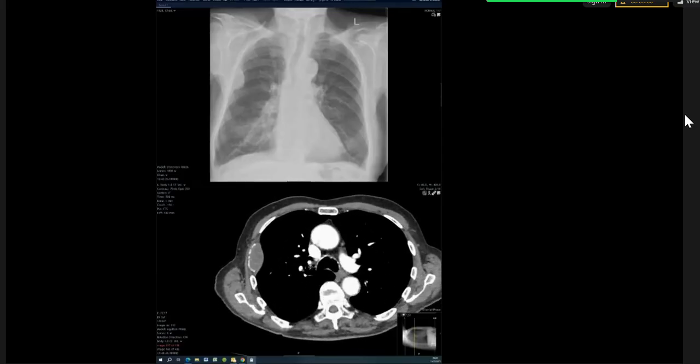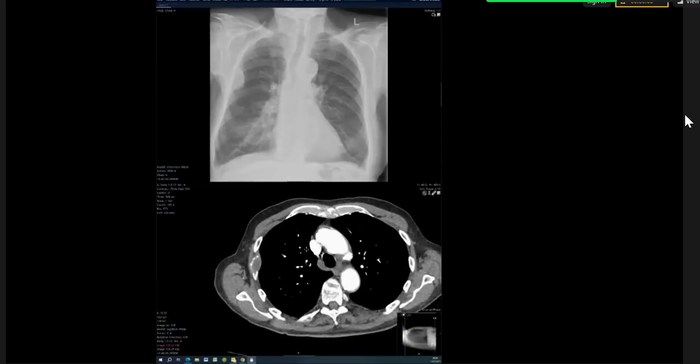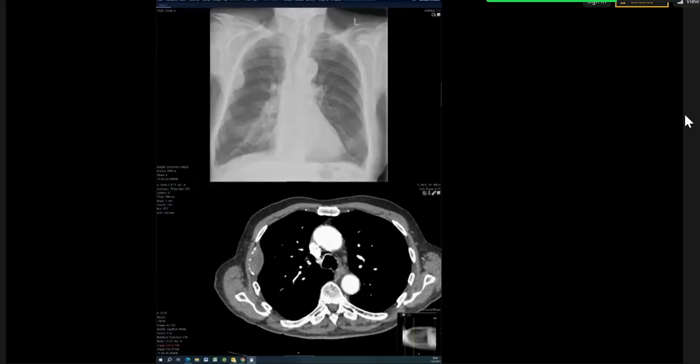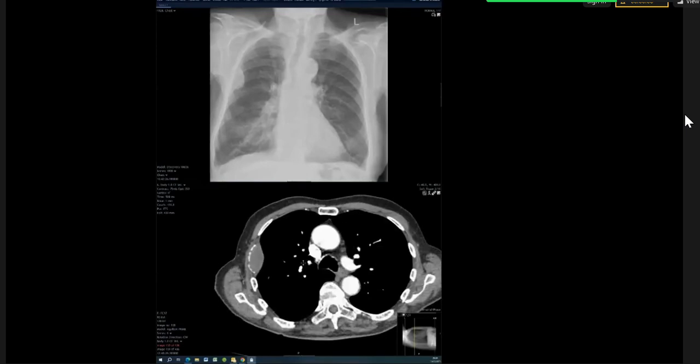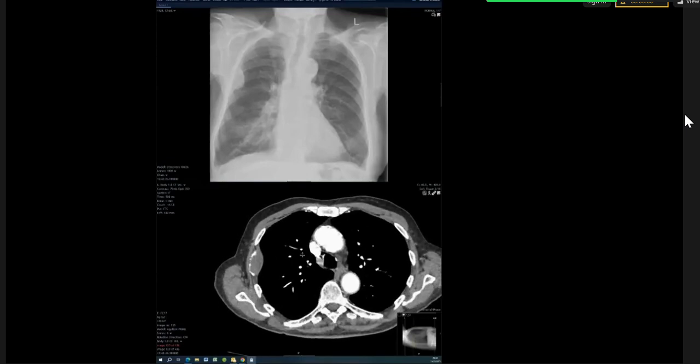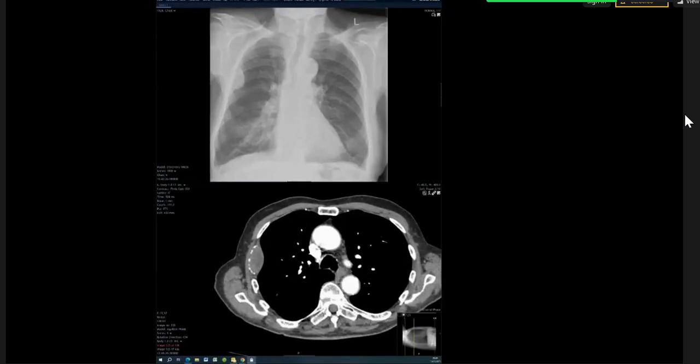It also has some peripheral areas of calcification, but I think that's residual rib. I would look at the other bony structures to see if there are any further lesions. Particularly, I would interrogate the spine to exclude any spinal compression or pathological fractures.